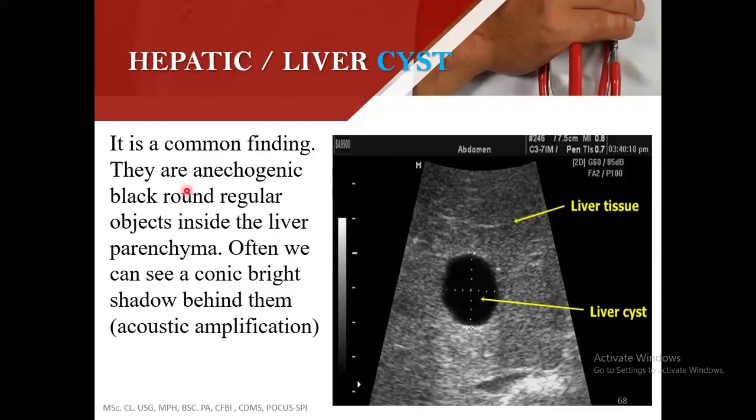But don't go and see a gallbladder and refer to the gallbladder as a hepatic cyst. Gallbladder, please. You should know the difference. If what you are seeing is confusing you, you must see the cyst at the same time. You must see a gallbladder somewhere. Don't just see something in the liver being anechoic and go and write hepatic cyst, when maybe it is the gallbladder. Do you understand?